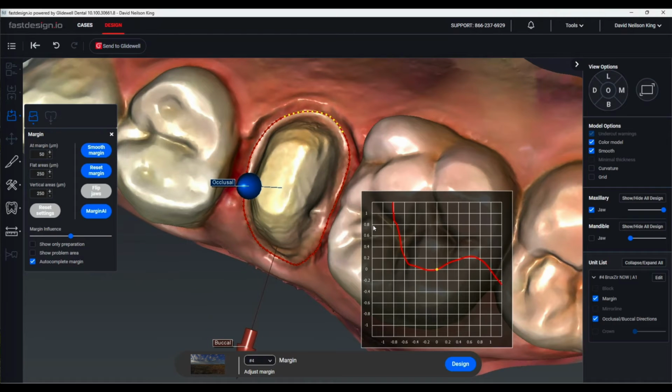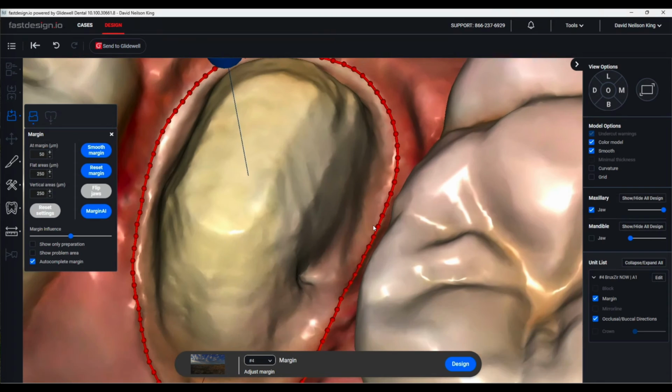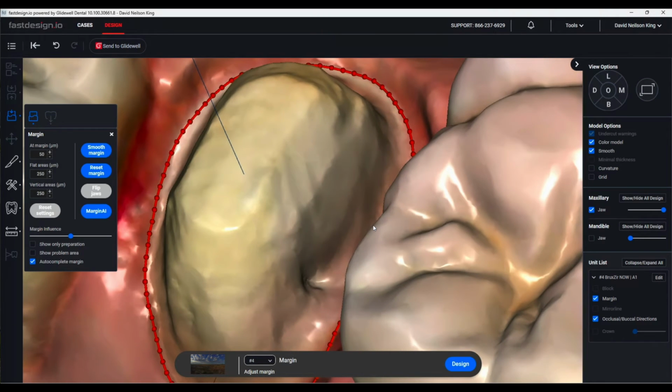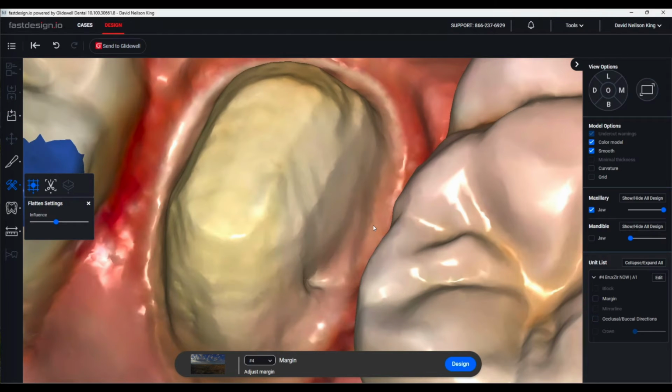What I'm going to do is go in and smooth that spot, kind of like using the replace tool. I'm only going to elevate it though. So here's my flatten. I'm going to change the size. I'm just going to run it right over here and that'll flatten.